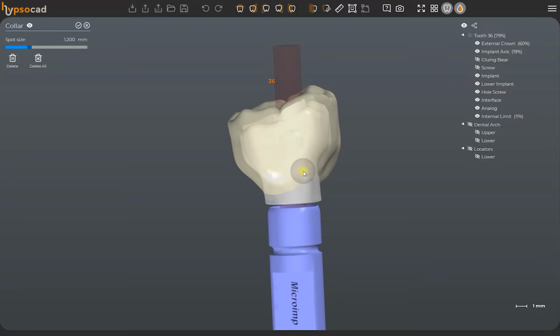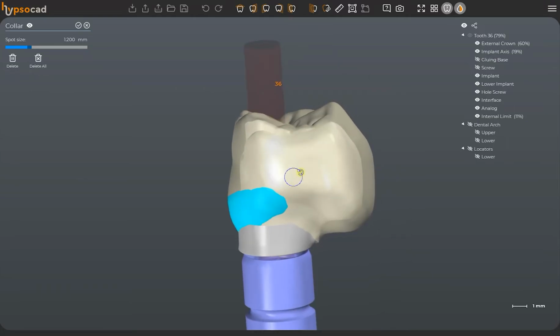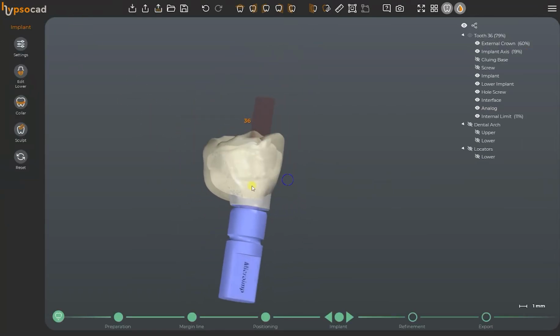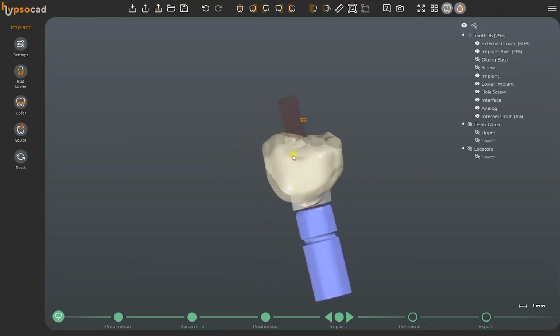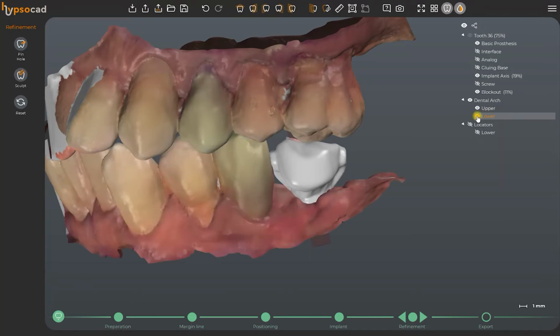With a brush, we can isolate the areas we may discard during the anatomy's reduction. In this way, we create lingual bends, occlusal stops, or mesial and distal contacts. We proceed to the refinement step.